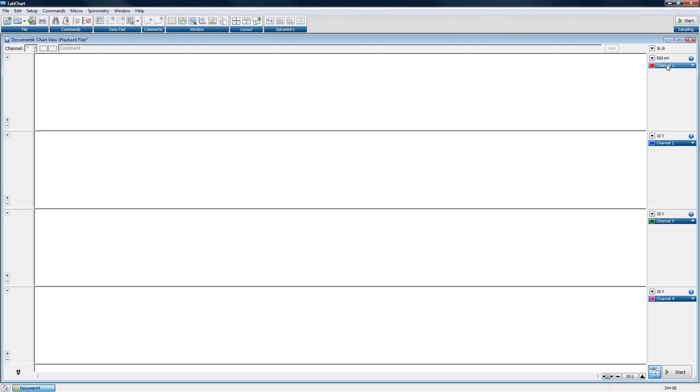The spirometry extension has predefined calibration values for every flow head that we market, anything from the MLT 1L to the MLT 1000L. We also offer our heated pneumotach, manufactured by Hans Rudolph, the MLT 800L. We have predefined unit conversion and calibration values that will take you from volts to liters per second.